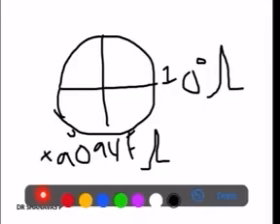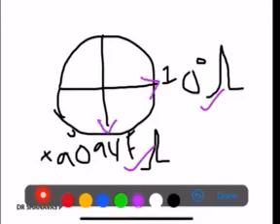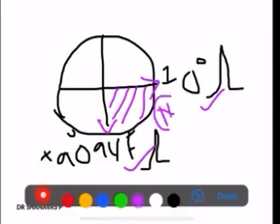So you are looking at an ECG and you find that lead 1 is positive and lead aVF is also positive. That means the axis of the ECG lies in this quadrant, that is, it has a normal axis.